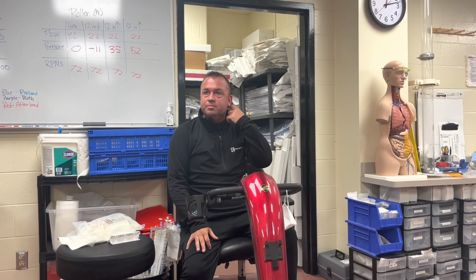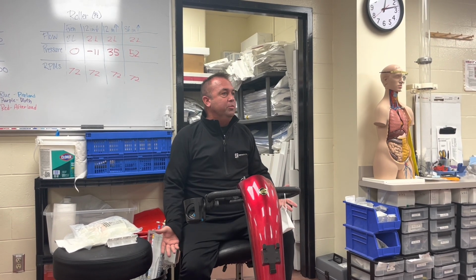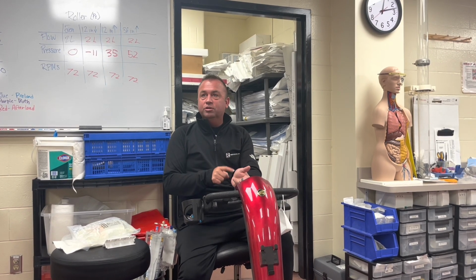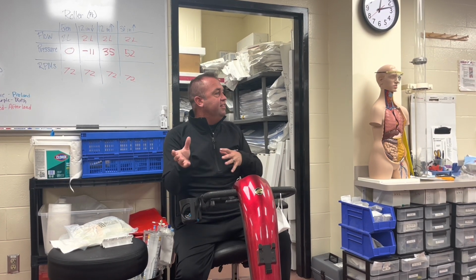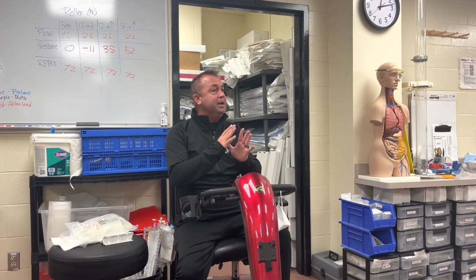And we'll look at that this semester and see that, and you'll see the difference, especially with pig labs. When we get there and we have our cannula in an actual pig, we will compare the radial line pressure, or for the pig, it's actually a femoral vessel, with the central cannula pressure, and we will find that mean, and with the heart and lung machine, we don't get pulsatile pressure, we just get a mean pressure.